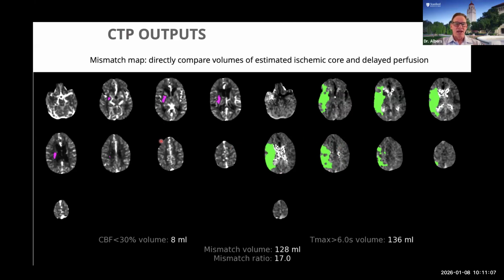And then on the other side, you're going to look at the area that has a substantial reduction in CBF. The standard is a less than 30% CBF compared to the normal patient CBF to identify tissue that's likely irreversibly injured. So how do we get this?